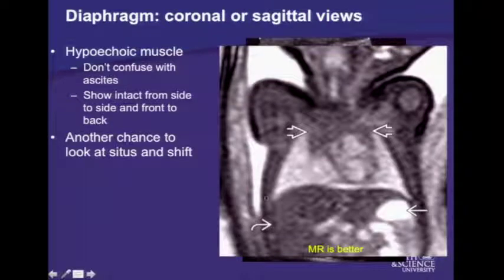Having said that, it's just worth knowing that it's really difficult to evaluate the full diaphragm, and when there is really a question about it, MRI is probably better in showing the diaphragm.